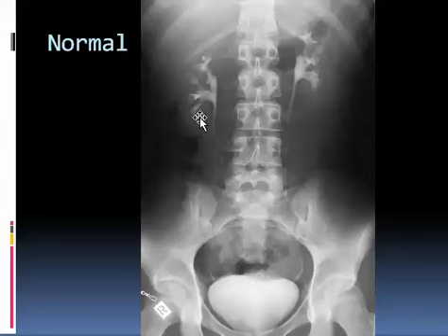The interpapillary line, that is the line passing in all these tips of pyramids, should be parallel to the surface of the kidney. This will be discussed more after. And the distance from the lower pole calyx to the surface of the kidney is usually identical on both sides, same as with the upper lobe calyx with the surface of the kidney. There should be some symmetry.